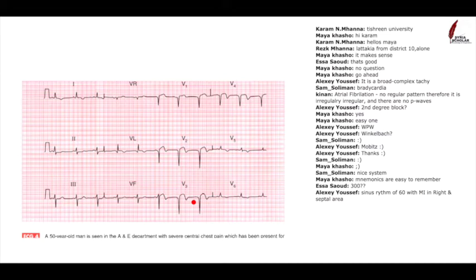The important thing is not to jump into making an immediate diagnosis. We always take the ECG and work through the system. If somebody hands you an ECG, you can't just say, this is this disease or this is this disease. You say, okay, I've got an ECG and I will do my system. I'll look at the rate, rhythm, axis, P waves, PR interval, QRS, ST segments, and eventually T waves. And that's it. You always start with that.